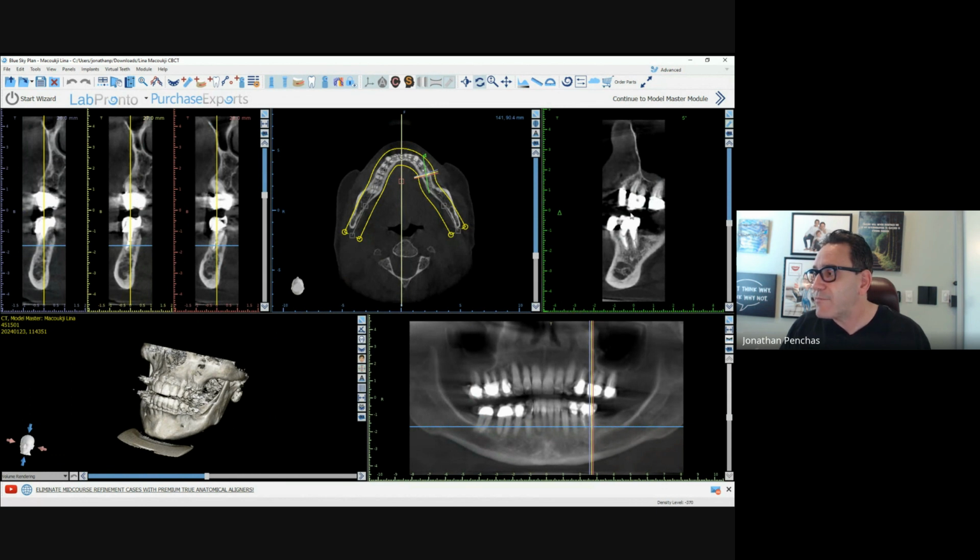And here is something that I like a lot, because as this turns around, look at the green line here, which is at 90 degrees. As you turn this, it's basically turning around that molar. It's turning 360 degrees. So you can get all of your shots in one turn. You're basically going around that area at 360. So very, very helpful. And we go back to the 90 degrees because now we're looking at each one of these vertical slices.